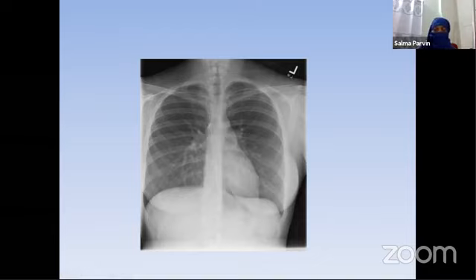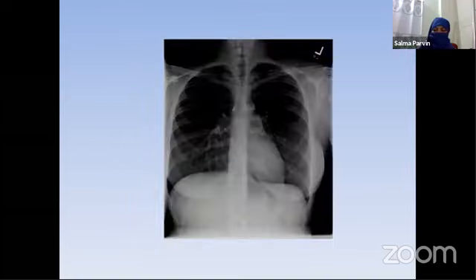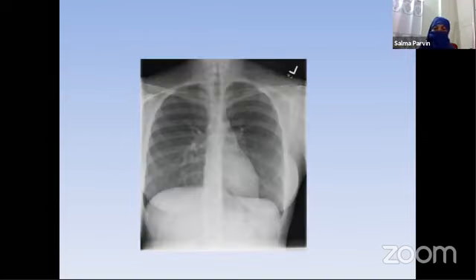You see, this is an X-ray film. This X-ray film has a thoracic dimension with the cardiac shadow to the left of the spine, and the chest film has the vasculature seen at the center and also at the periphery.